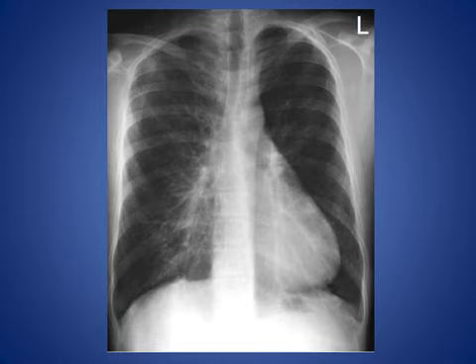Here, chest X-ray, what is striking to you? Where is the cardiac border on the right side? What is the orientation of the ribs? These are clues to you. So this is the pathology. It is a pectus excavatum.